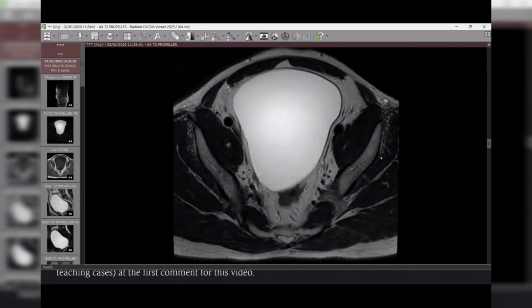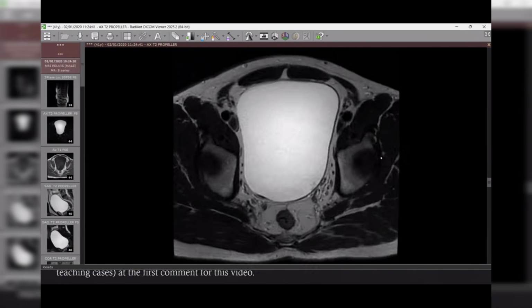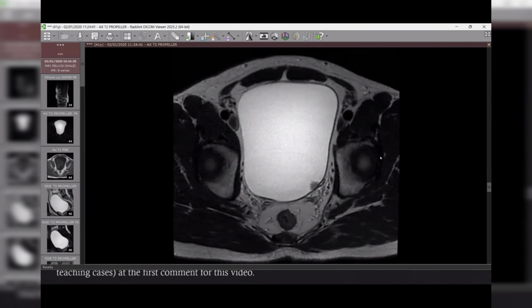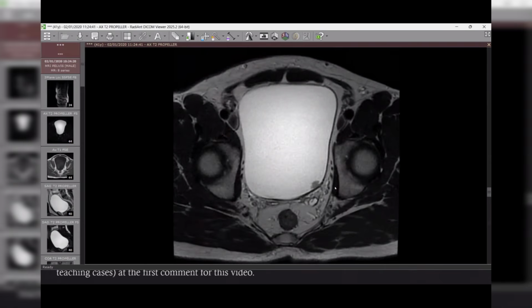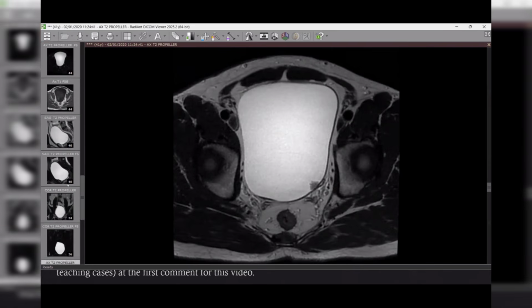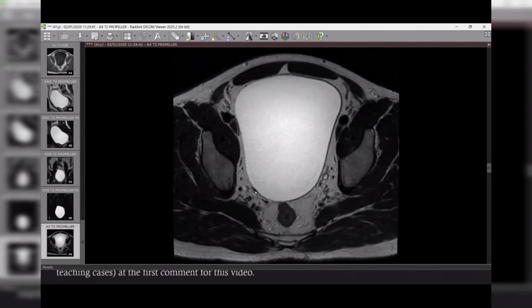The differential diagnosis for this could be blood clot, or it could be a mass in the urinary bladder. But this serrated outline doesn't look like hematoma really, though it's very suspicious. If you are suspecting hematoma, what should you do to confirm? I would look at T1 also. Because it's dependent, and the patient is coming with hematuria, I'm just putting it as a differential diagnosis.